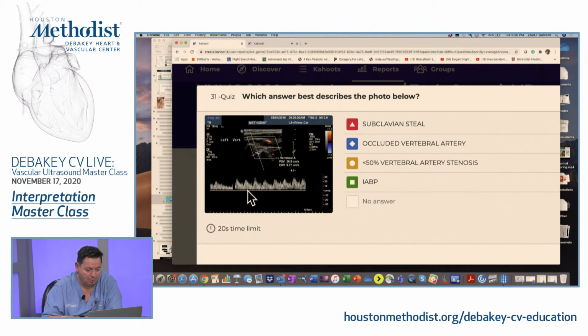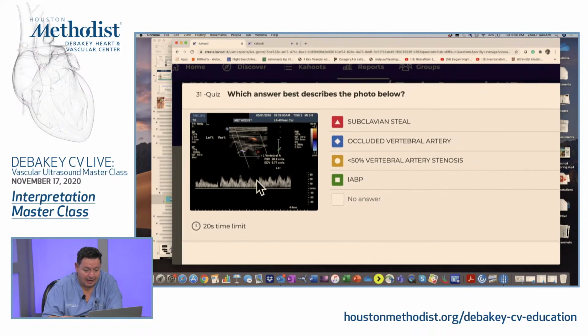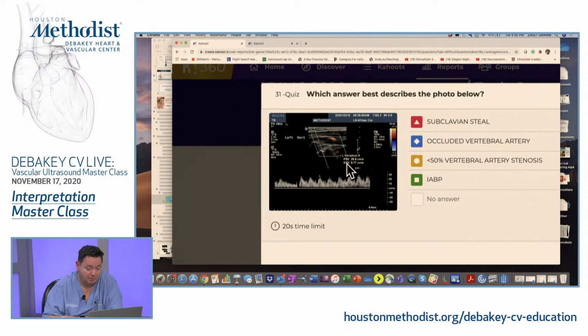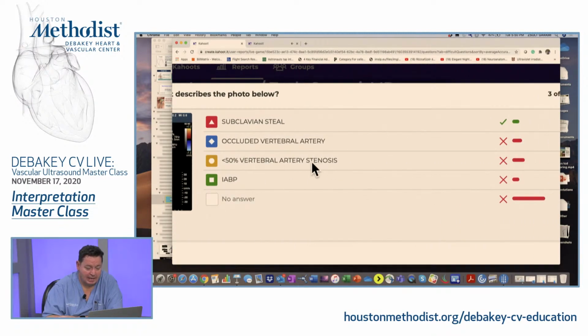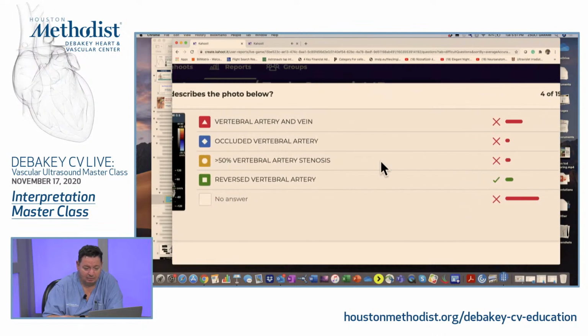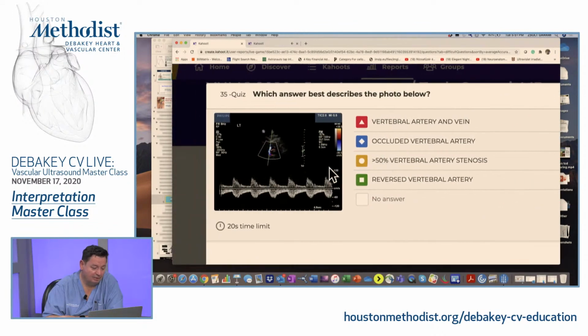That was my other waveform. This was a left vertebral, really fancy, and this is one of those V-shaped cutouts I've seen in systole. Basically, very few people got it, saw the subclavian steal. Everybody wanted to say, based on the velocity, hey, this is a normal vertebral because the velocity numbers are okay, quite low to be honest, but again, no stenosis. And some people thought that this is an intra-aortic balloon pump. I'm extremely proud of those answers, how I really wanted to see how the people were thinking and what they see on these different waveforms.